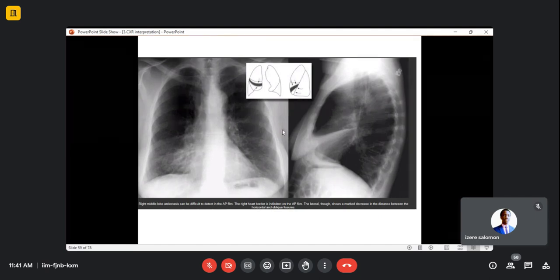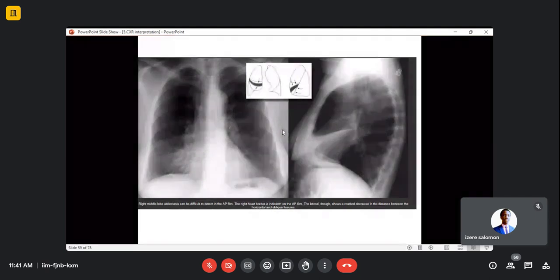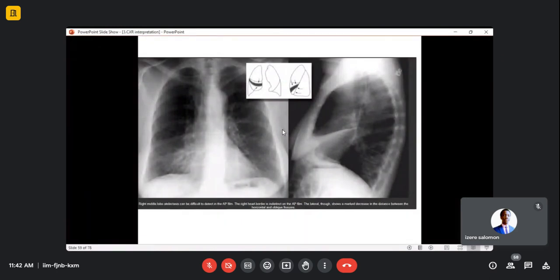But still, I'm confused as a medical doctor. I don't want to be a witch doctor and say this is pneumonia. Maybe if there was a clinical history of fever, cough, and chest pain, I could say straightforwardly that it's most likely pneumonia, consolidation.